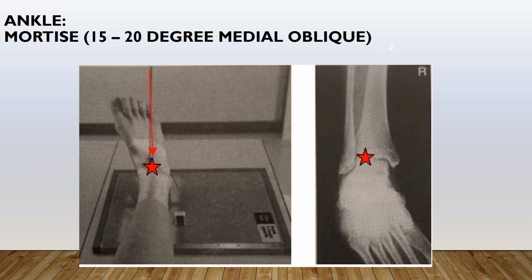And you want to evaluate your image so that the entire ankle mortise should be open with the distal 1/3 tibia and fibula. The lateral and medial malleolus, talus, and proximal half of the metatarsals are all within the collimated field. You need to open the lateral and medial mortise joint surfaces, and your malleoli should be in profile. Soft tissue structures, bony margins, and sharp bony trabeculation are clearly demonstrated.